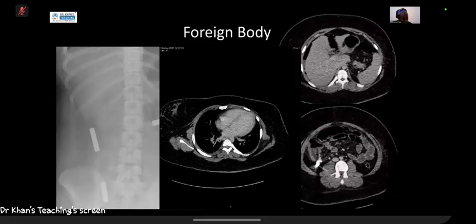She had a subsequent x-ray, which I've not shown you, which also showed that this battery here was not moving. It was just staying stuck here, and she was clinically deteriorating with worsening abdominal pain and fevers. So she went on to have a CT, which I can't show you, unfortunately, on the video, but this is that battery here. It's actually perforated through the bowel and ended up in an extraluminal position. And you can see that she's got pneumoperitoneum in the abdomen secondary to this.